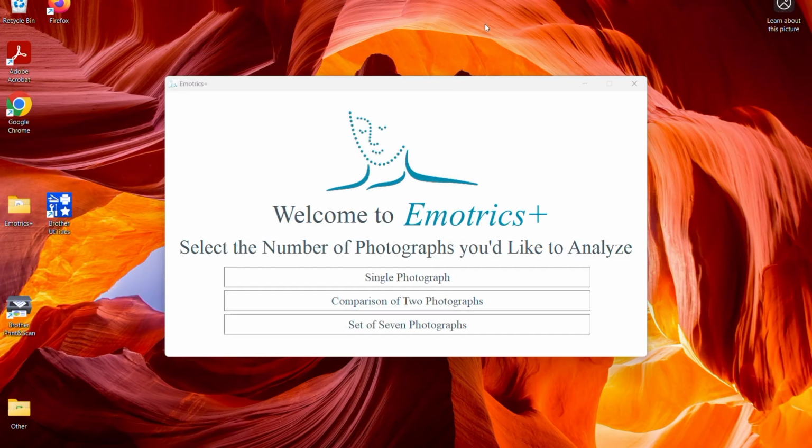We hope that it demonstrates the potential of the Emotrics software to aid in your research. If you have questions regarding the software, please reach out to our group, as we are more than happy to work through the program with you.